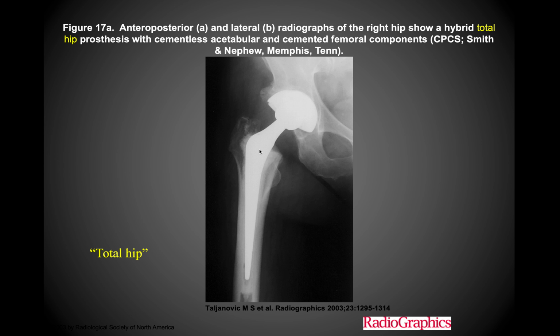So you can see how that mimics basically the head and neck of the femur in a non-revised hip. And so you can actually see here where the head and neck of the femur is removed in the surgery and fully replaced by this part of the joint implant.